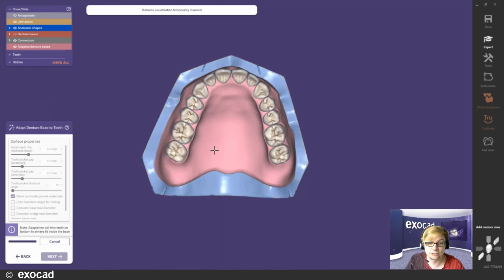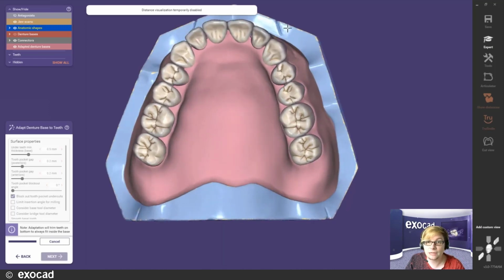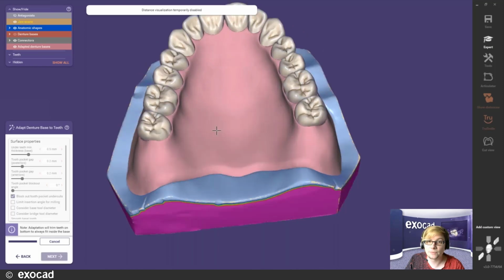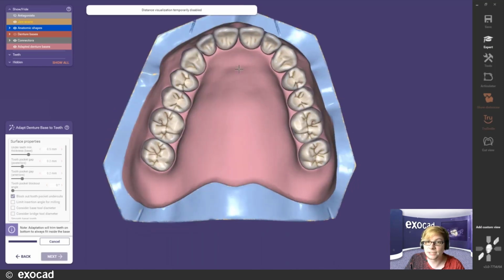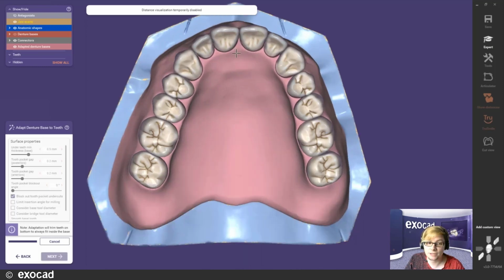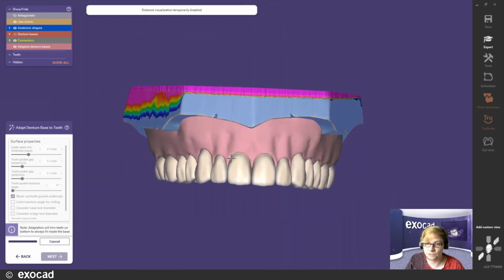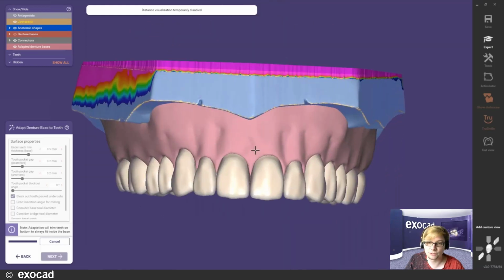That's why the calculation here is a little bit more complicated for the software, obviously. And it's going to free up, as you see, not only the teeth, but also the connectors and so on. We try to place the connectors on the palatal area more or less. So based on the insertion axis of all of those teeth, the software has to cut away the gingiva in areas like this. It's only here in the palatal or lingual area and not on the vestibular one, because there you want to have your aesthetics.